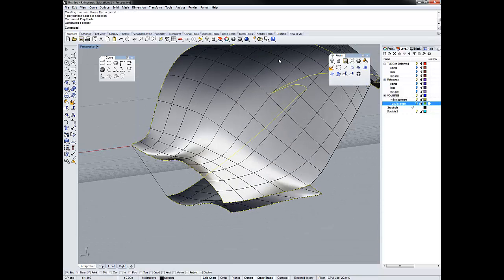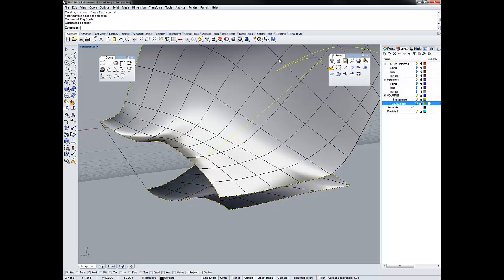All right, so what you can see here is a visual indication of what we have yet to do. So this one border, which spans the entire length, needs to be split along this line right here. So we're going to do that now. I've selected split, and now we're going to select the cutting objects, which is right here, right-click. It's split into 2 pieces. We also need to split it here.